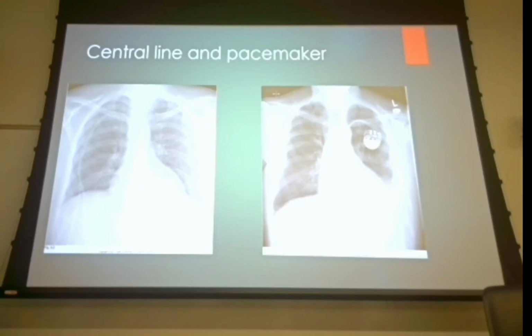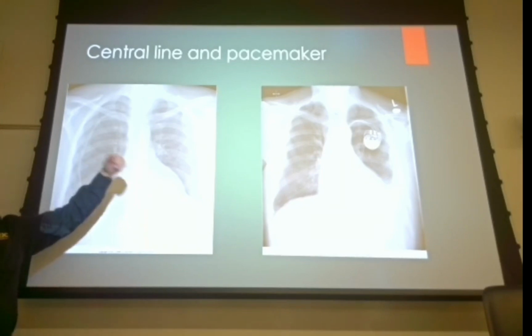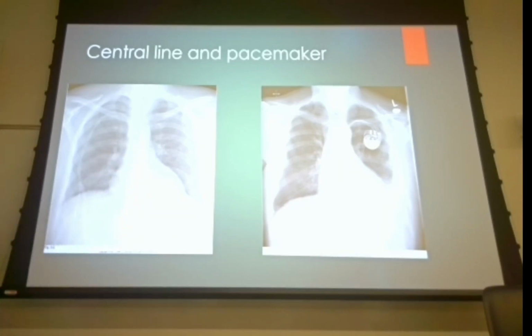Collapsed lung, right. So if you have to adjust your technique or your positioning or anything that you're doing in a case like that, then what you're going to be shooting for primarily is to visualize presence of pneumothorax. Secondarily would be placement of that catheter. Okay, so understand the environment when you walk in.